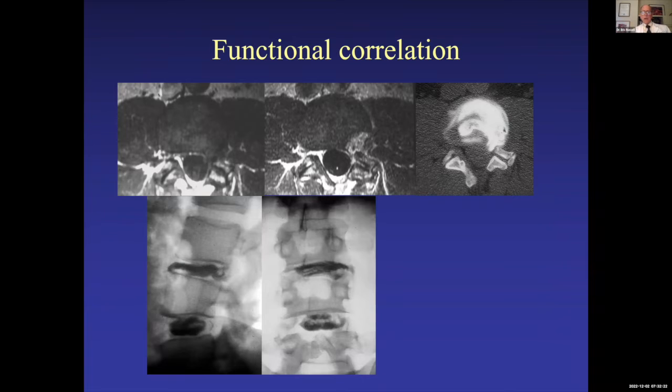This is a discogram. I used to do discograms, believe it or not. They're helpful clinical tests. The imaging studies aren't very helpful typically, but they may support certain theories about what's wrong with the patient. This patient had left-sided radicular pain and localized pain in the back.